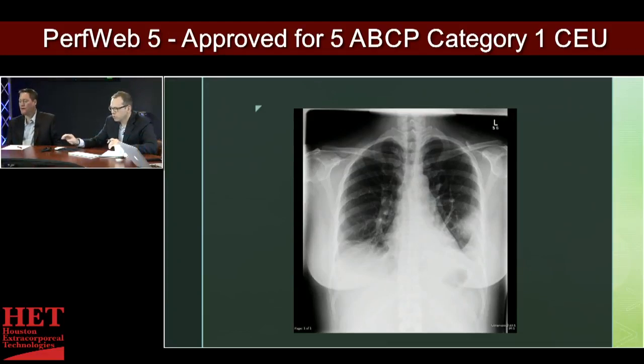Okay. But more specifically over here, in the left lower lobe of the lung, I would call this kind of a triangular defect here. Pretty distinct borders. That's going to be a classic x-ray finding of a subsegmental pulmonary embolus. Oh, really? And so you get a wedge-shaped infarct where you get lack of flow acutely to the lung, and that's where the shortness of breath obviously comes. You get some inflammation, so you can get the pleuritic chest pain or the pain with deep inspiration.